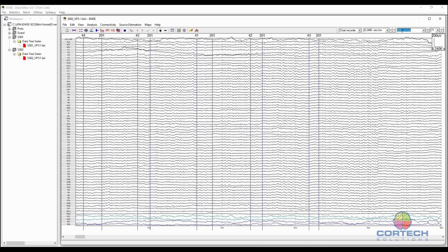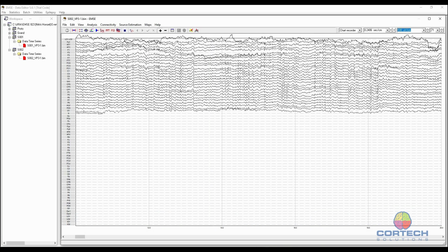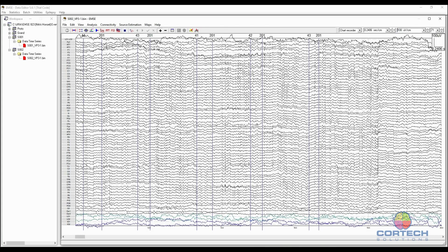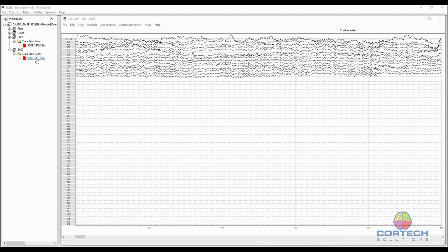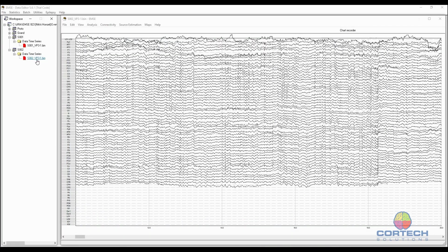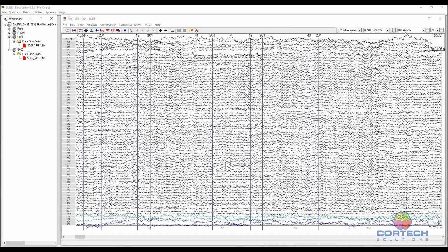If we wanted now to change the display preference for Lloyd's data, we can do it here, and it'll stick for Lloyd's data if we want his display preference to be now different. If I unload this and reload it, the display preference is now specific to Lloyd's data.